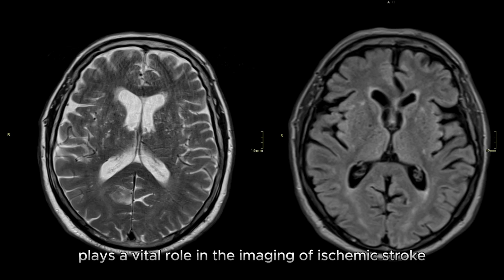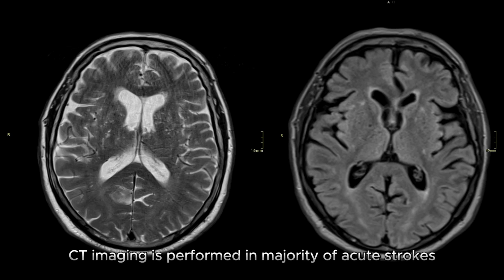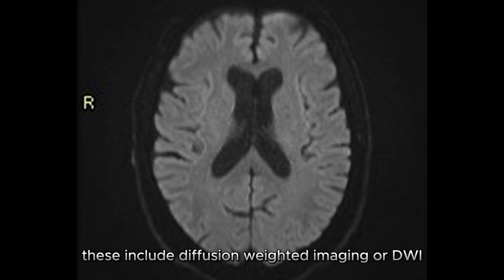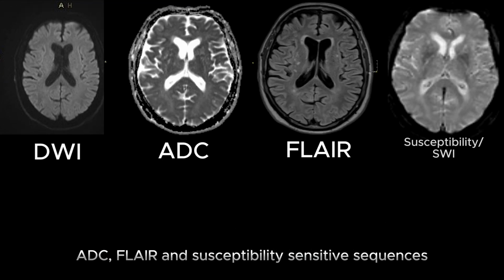MRI plays a vital role in the imaging of ischemic stroke patients. Although CT imaging is performed in the majority of acute strokes due to various factors, MRI is more sensitive for ischemic stroke. When you examine an MRI for ischemic stroke, there are a few essential sequences to look at. These include diffusion-weighted imaging or DWI, ADC, FLAIR, and susceptibility-sensitive sequences.